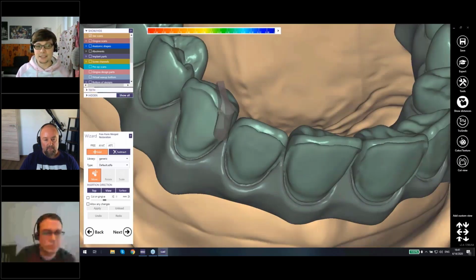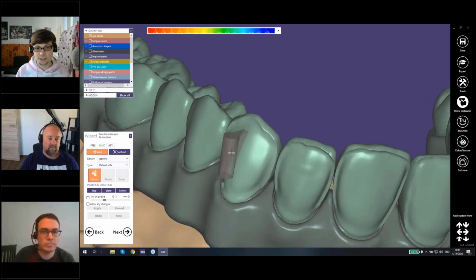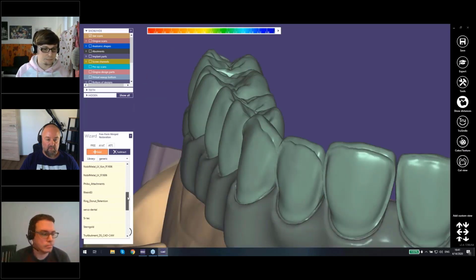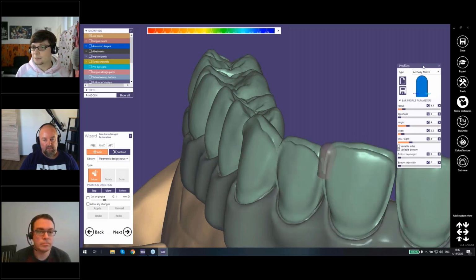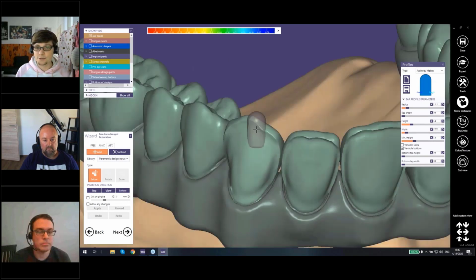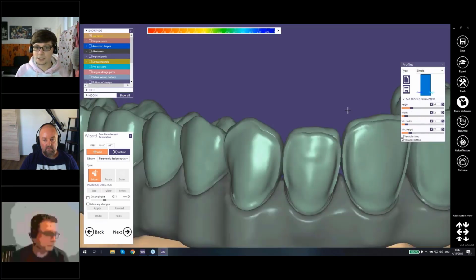In the attachment step here, you can select what type of attachment you want to use. The generic one is just a simple vertex piece. You can select all different types of attachments, and you can create your own parametric designs, in this case based on a rotation. It sounds a little more complicated, but you just use this 2D picture to create a 3D object, which just gets rotated. So I'm going to select something fairly simple, like this.